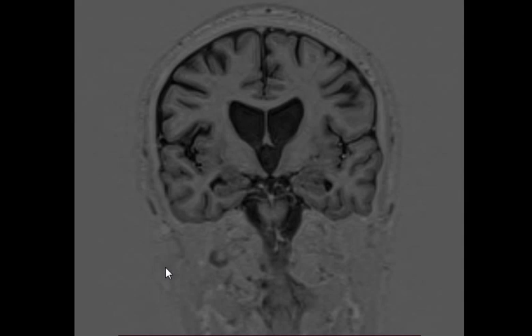But this appearance of the ventricle with the basal ganglia is typical for Huntington disease. Keep this in mind. This box-shaped lateral ventricle is typical, especially when you have this amount of basal ganglia atrophy. Okay? Thank you very much. Excellent. Very nice.